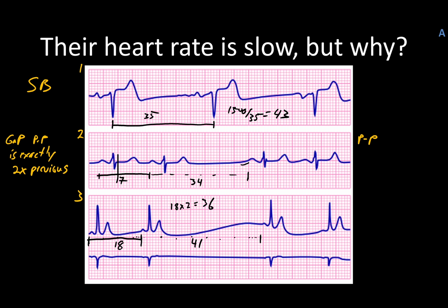So, plain and simple, that's what we're after. In the second strip, we meet the criteria of being exactly 2. In the third, we have a gap greater than 2 times P to P.